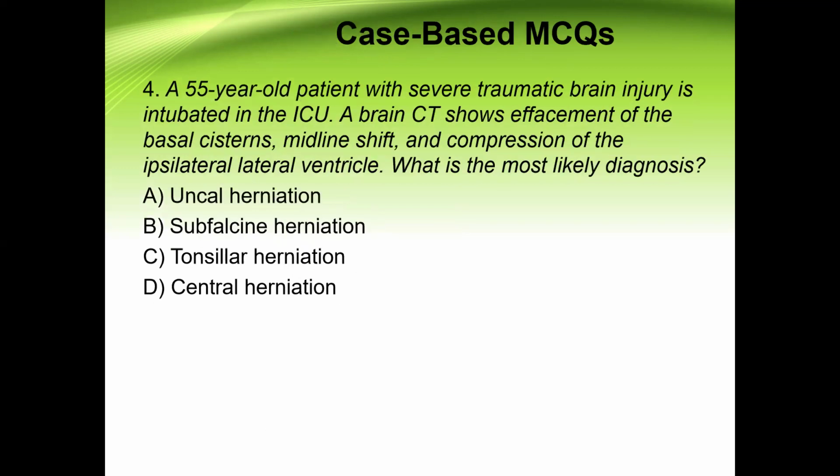A 55-year-old patient with a severe traumatic brain injury is intubated in the ICU. A brain CT shows effacement of the basal cisterns, a midline shift, and compression of the lateral ventricle. What is the most likely diagnosis here? Anyone?